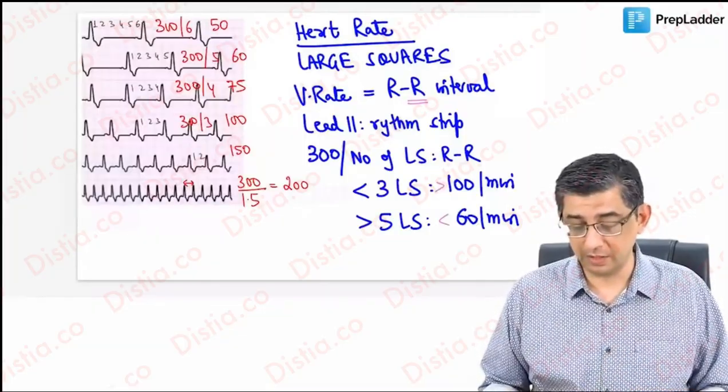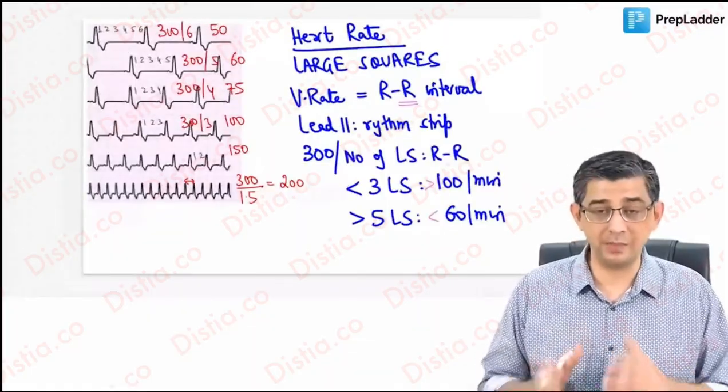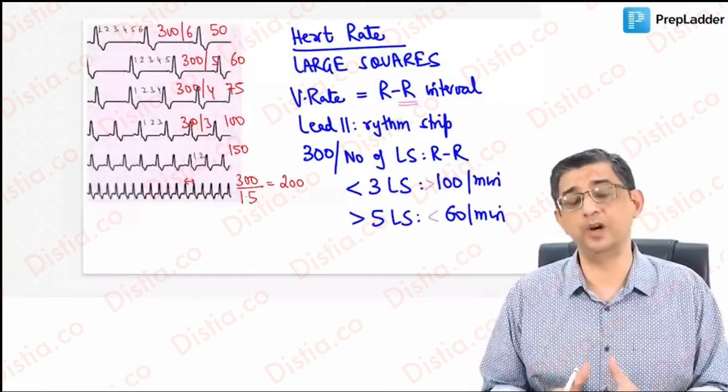So the message here is that all of these steps are important. Don't just think that we are doing mathematics here, guys. Each of the steps that we're discussing do have their diagnostic relevance. They have their diagnostic importance as well.